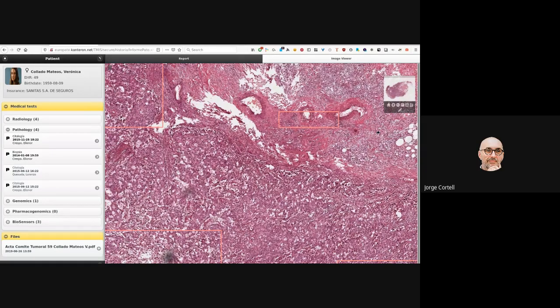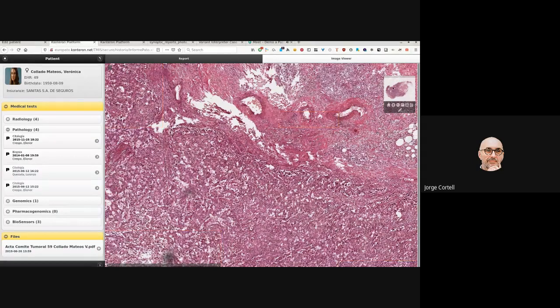And the reason, technically speaking, is that we have a predictive algorithm. As you move the mouse, it frees up a memory area, and then loads the next. So it doesn't freeze. It just continuously loads and unloads and loads and unloads.